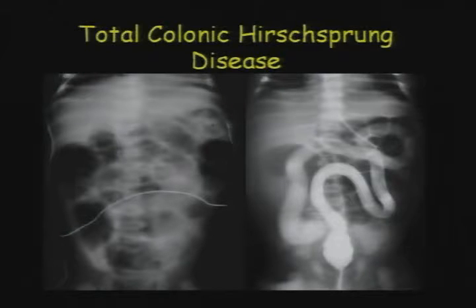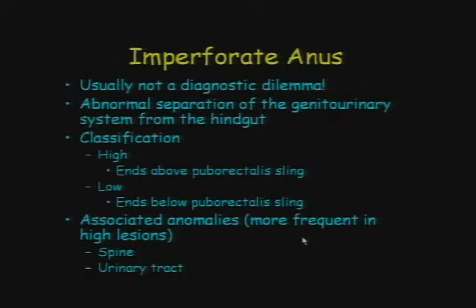Hirschsprung's can involve the whole colon. It can involve the whole bowel, in fact. And here you can see a baby that has a distal obstruction, lots of dilated loops. When you look at the colon, the rectum is bigger than the rest of the colon, but the colon is very short looking. It's like a question mark kind of colon. And it's very featureless, and that's a clue that you might be dealing with total colonic aganglionosis. And again, a biopsy will confirm that diagnosis.